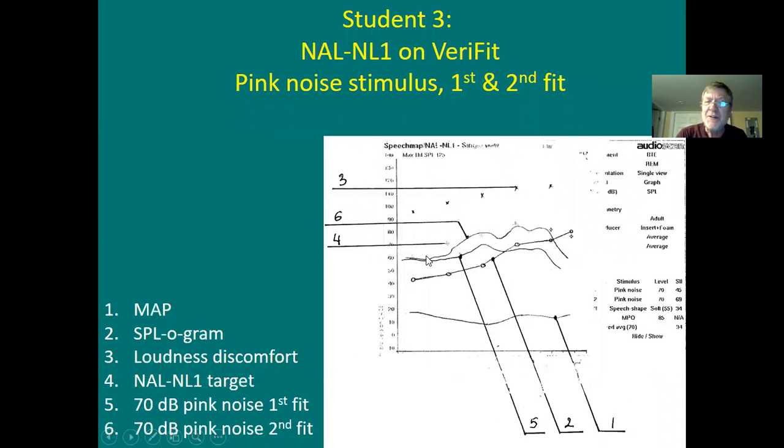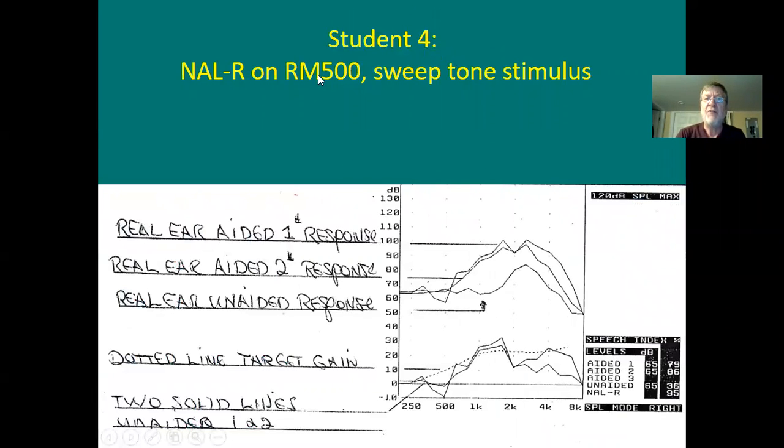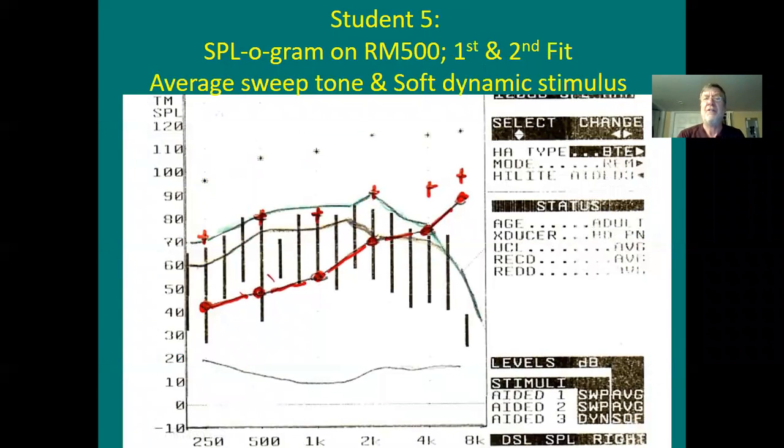Unlike this one here. This one's harder to see. I really should paint that clearer. But and another one with now R. Again, first fit, readjusted fit. It just doesn't stop. Here, minimal audible pressure, the hearing loss, loudness discomfort levels, the targets, got to be DSL-4, look where they are. Manufacturer's first approximation to DSL-4 targets, readjustment in order to hit DSL-4 targets. Okay? It's like one after the other.